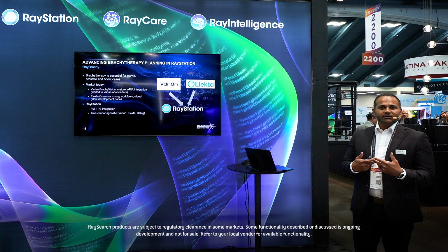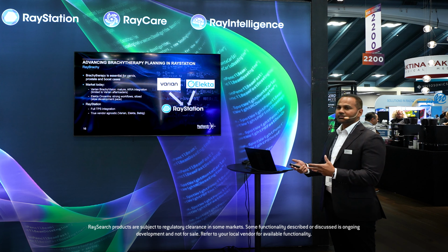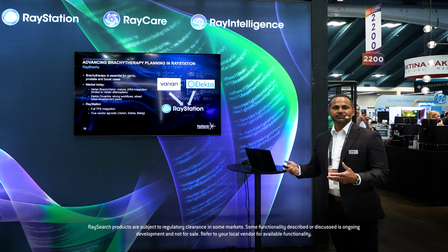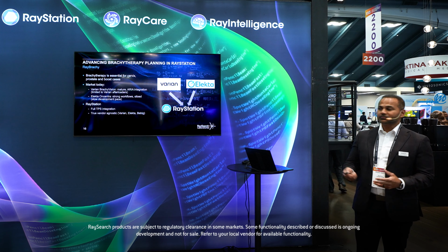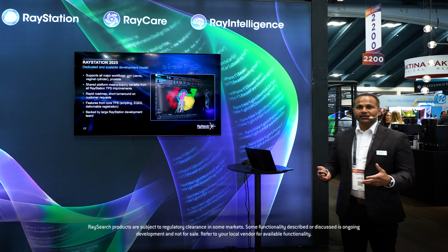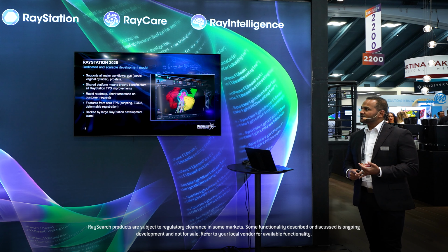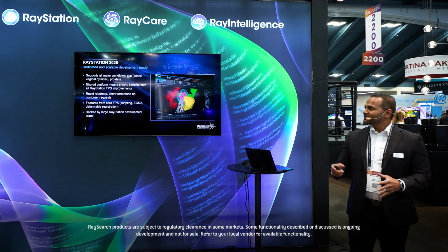So what are we doing at RaySearch with RayStation? We're fully integrating brachytherapy into our treatment planning system. It's a true vendor-agnostic application where we have the ability to plan for Varian, Elekta, and BEBIG as the afterloader, and you get the full TPS integration with that. We're really dedicated to the brachytherapy application, and it's something that's scalable, by being able to support all the major workflows, so gynae, vaginal cylinders, and prostates.